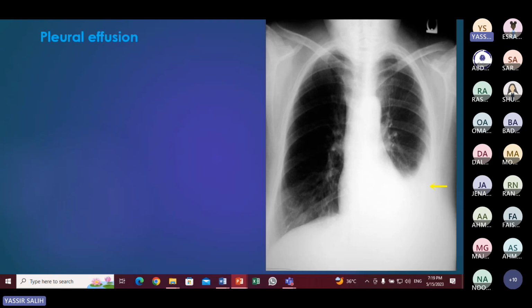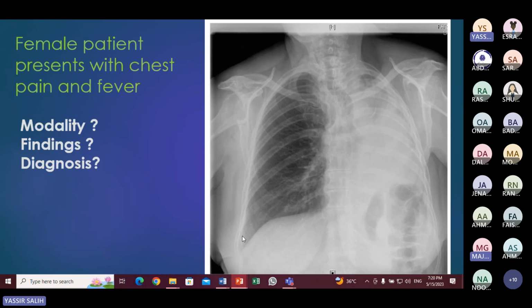What other sign of pleural effusion غير المينيسكس sign? إذا كان عندنا small pleural effusion بتعمل لنا obliteration or blunting of the costophrenic angle. إذا عندنا small pleural effusion بتعمل لنا blunted costophrenic angle، يعني بدأت تلقى الشارب كده بتبقى blunted or obliterated. دي small volume accumulated in this dependent area.